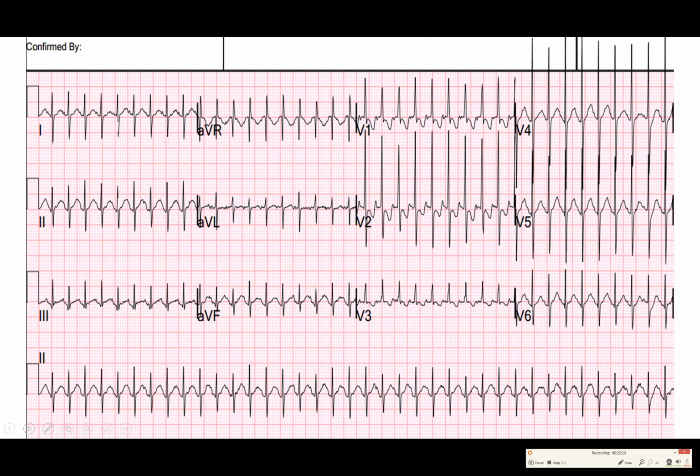Okay, here we have another full 12-lead ECG, but we're going to focus here on the rhythm strip, which is showing us lead 2 for the entire time period. First question, is it regular or irregular? I think you can see that it looks regular. You can probably also see, especially if you've gone through the rate lectures, that this is quite fast. So let's pick one that is almost on a bold line, so we would say 300, and that's 150, so it's between 300 and 150.